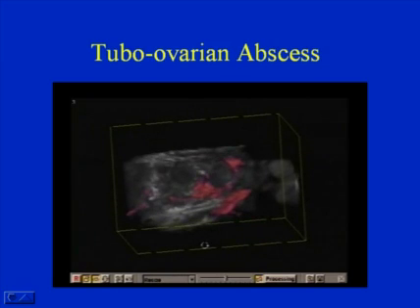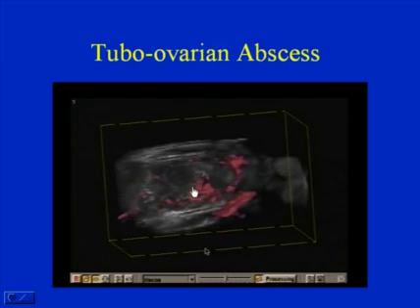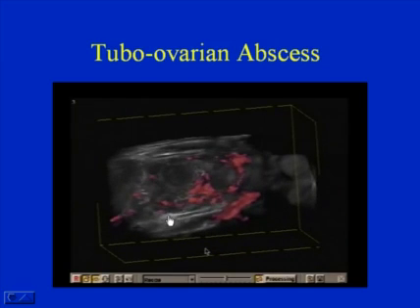We can see the locules that are present inside the lesion, and these would contain perhaps a few cc's of pus, but the needle would have to traverse the large vessels to get to them, and therefore it was not a very good idea to try to aspirate and get the very small amounts of pus inside of this ovarian lesion.